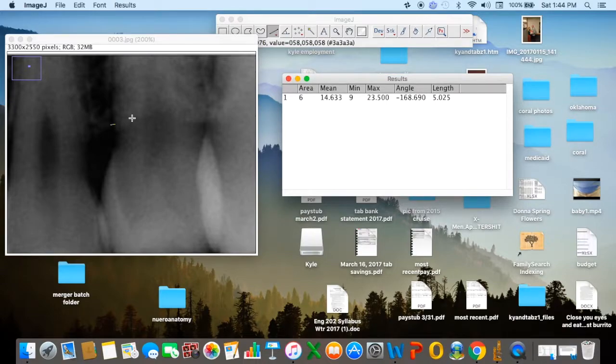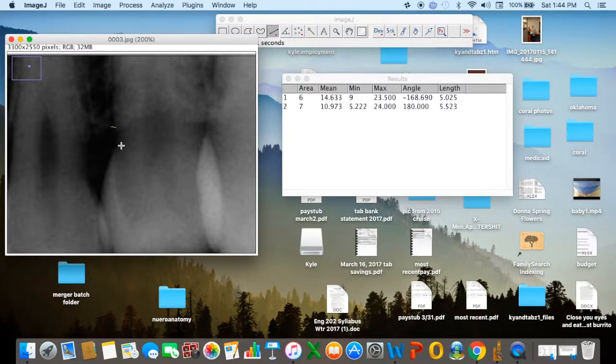We're going to take our measurement. Our little results box will pop up. We're going to take approximately 3 measurements of that same space, and we want to try and be consistent and be in the same spot. If you'll notice here, it'll also give you the angle of your line, and we want this to be fairly close, within 10 to 15 degrees probably.